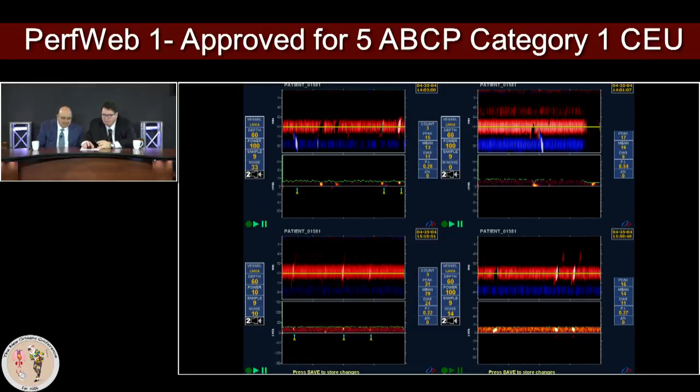So let's look at the left bottom image. When you see the letter A, that's a high speed, probably small embolic material. When you see something closer to the baseline, this is slower moving, so it has to be a bigger piece. Something higher up in your waveform is probably a small piece because it's traveling at a higher speed. So based on the speed, I'm trying to differentiate them.